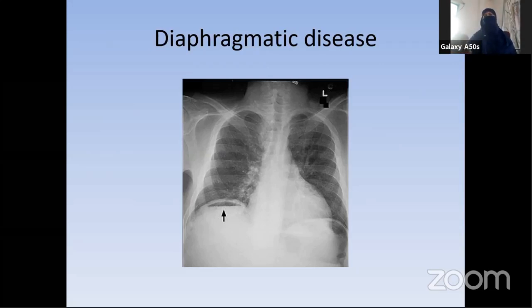It means this patient can stand up, so the patient has no acute condition. Now, what is here in this film? There is a long fluid level seen here under the right hemi diaphragm. The wall of the lesion is not thin, it is a thick wall lesion and has an air fluid level. And you see that the hepatic mass is continuous with this shadow. The hepatic shadow is basically displaced down. So there is an object seen in between the right hemi diaphragm and the hepatic shadow with a long air fluid level.